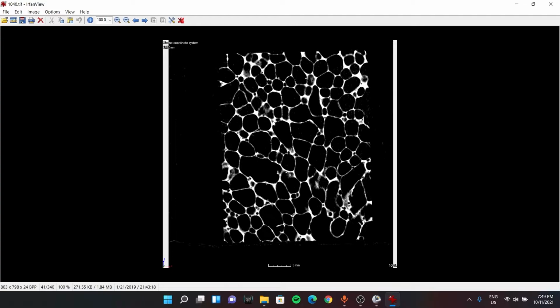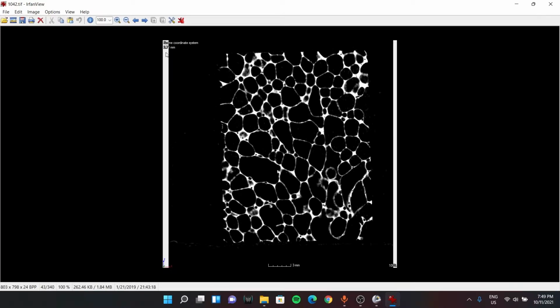The scanning layer depth. The CT scan scans in a layer by layer method. For every layer, the distance is given from the bed. The bed is 0, the machine's bed is its origin, and the top is this object's top dimension. If you scroll through every image, you can see this number changing. So it is 3.82 mm, now it is 3.77 mm, 3.71 mm.